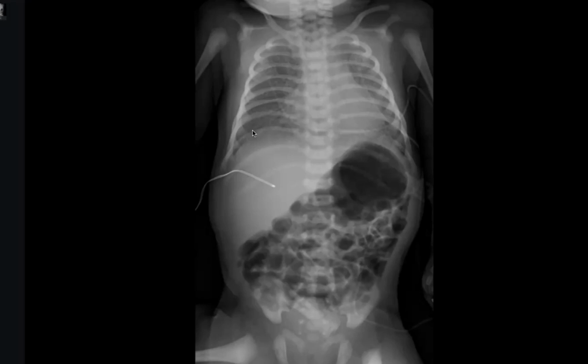Very critical. My colleague, lung volume is the key for all chest abnormality. If it is reduced, you are on the side of RDS with its complication. If it is preserved, it may be transient tachypnea of newborn. If increased, we are talking about meconium aspiration, like this. Very critical, lung volume.